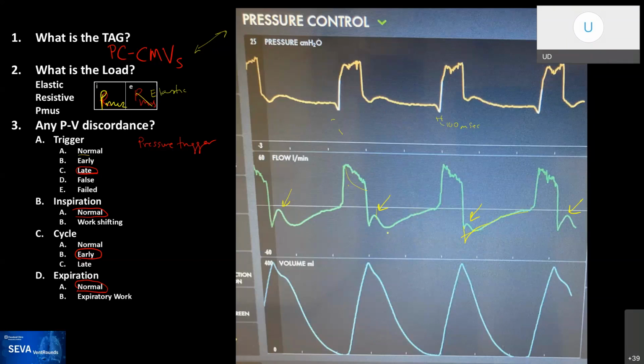Yeah, it means that there is a resistance in the system. Well, you can have expiratory work regardless, but yes, you would be fighting against the ET tube and the whole system. But you could be working against a closed valve, and it would not necessarily be resistive. Under those circumstances you're just against a valve and there's no resistive load, it's just elastic. So we'll talk about that.